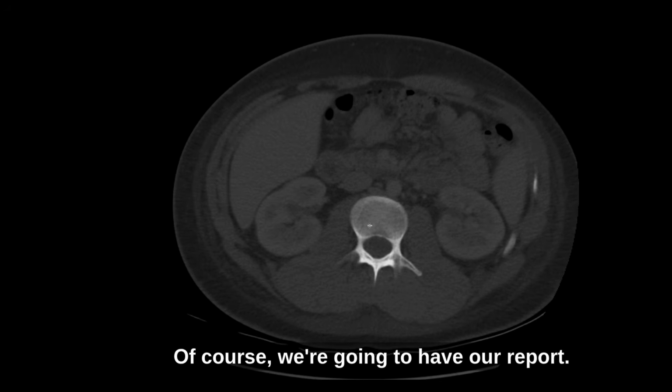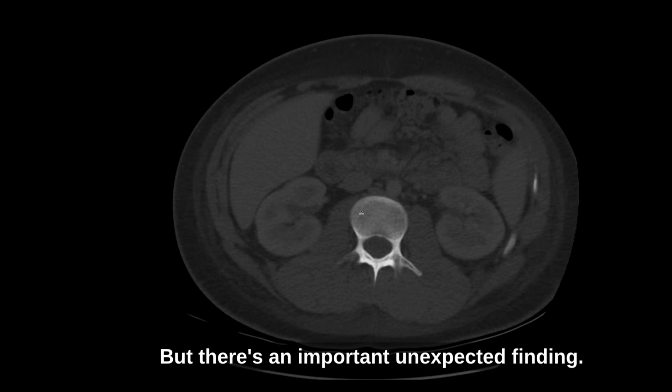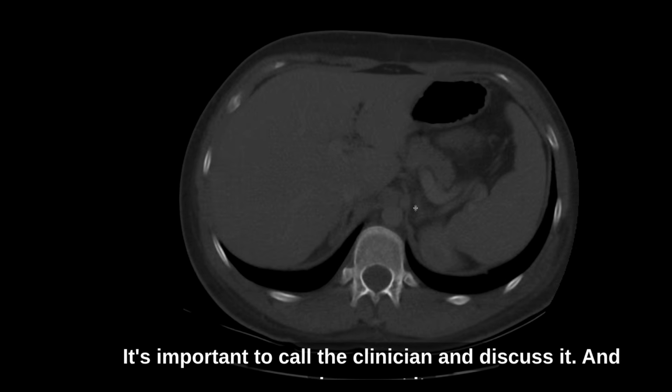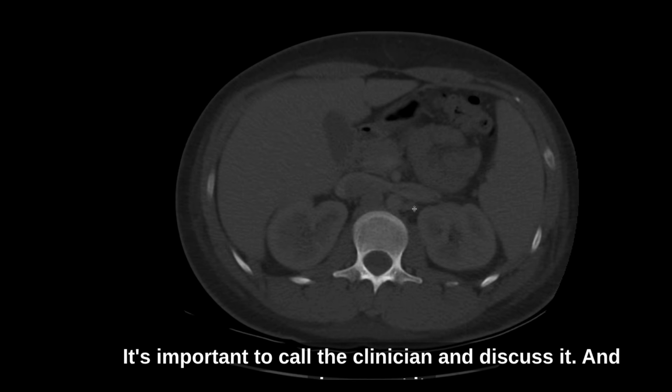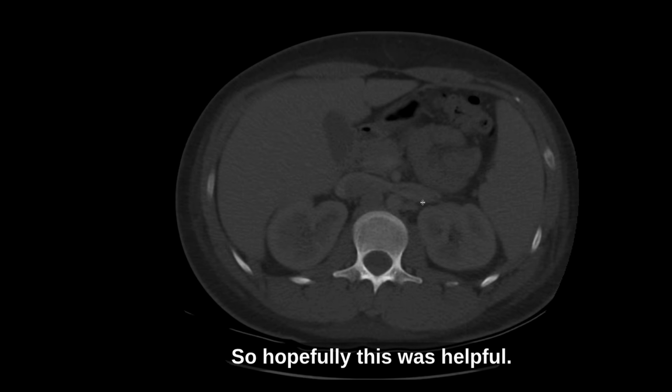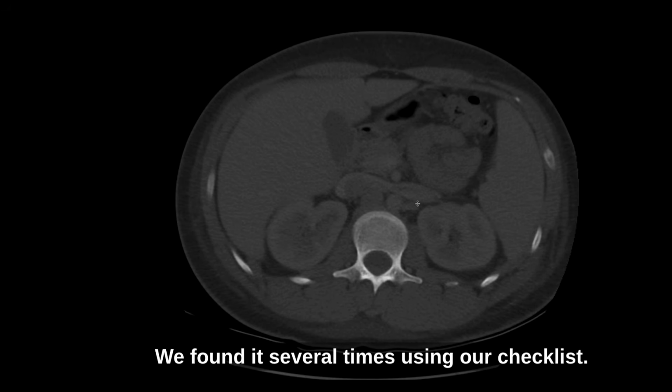Of course, we're going to have our report. We want to answer the question. We want to be succinct. But if there's an important, unexpected finding, it's important to call the clinician and discuss it and document it. So hopefully this was helpful. There was one great finding on here. We found it several times using our checklist.